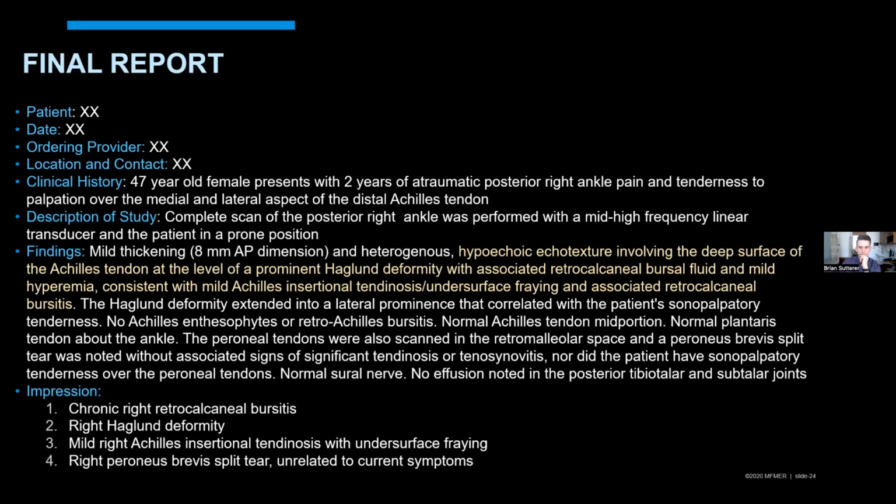And I think the other thing to mention is there are a lot of accessory tendons that can be seen down in this area, quite a few. Just knowing and being aware of some of those accessory tendons can be really helpful. For example, we had a patient who ruptured their Achilles, and we just published this not too long ago, but it had essentially an accessory lateral gastroc tendon without an accessory head. So there are all these different types of anomalous tendons down in that area, and being mindful of that can help in some of these patients.